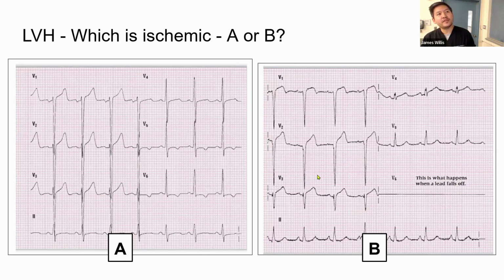Yeah, this one's tough. I don't know if you could call a STEMI on this, but the morphology in V1 is not curvilinear, right? It's almost dome-like. Here you have Q waves instead of the R. Q waves in V1 as well. And this ST elevation is pretty tall for the S wave. So this one looks like typical LVH pattern, and this could possibly be an MI.